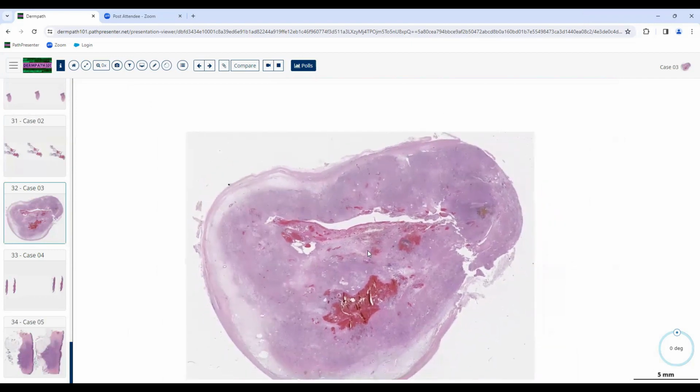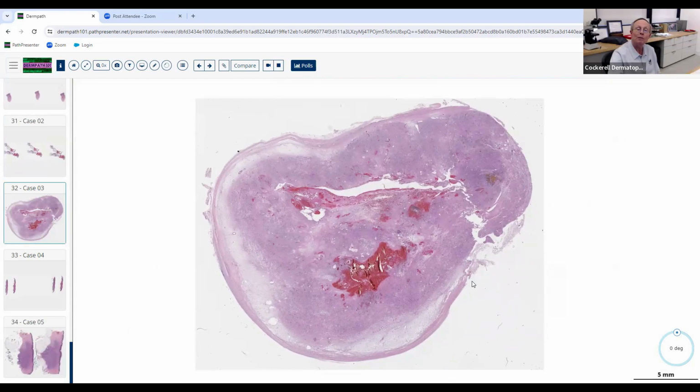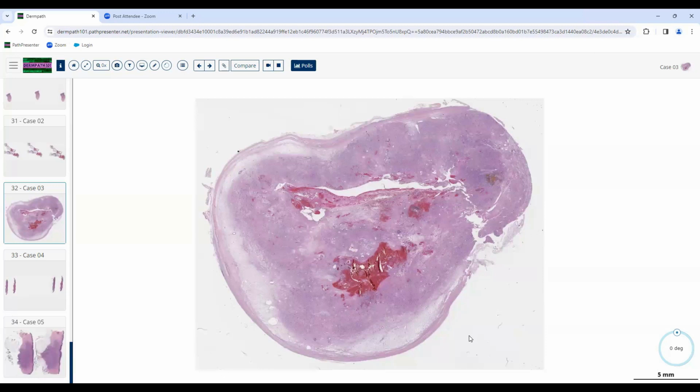Okay, so this is very big, maybe like an excisional, or maybe a saucerization shape, might have been pedunculated. Yeah, maybe pedunculated. It looks like neoplastic. Good. Not quite sure if epithelial or not epithelial at this power. Could maybe be either one. I don't disagree with that. You like benign or malignant? It seems well circumscribed and pretty symmetric, so I'm going to say benign.